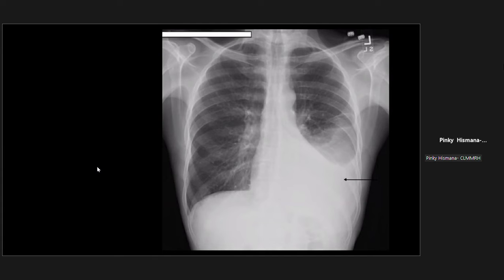Yes, doctor. And can you describe what's the abnormality here? Is it an opacity or lucency? Opacity, doctor. Opacity. Good, very good. So at the left basal lung or left lower lung, there is an opacity which is actually meniscus forming, no? It is quite a homogeneous opacity.